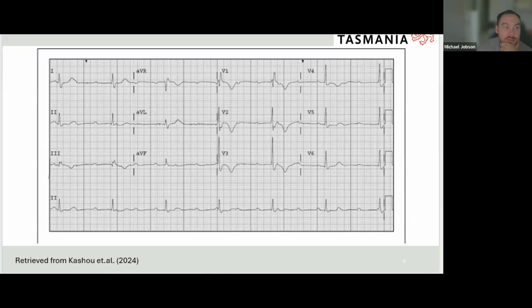If we look at 25 millimeters per second for this paper speed, that has to be right, otherwise our timing's going to be off. Each 1 millimeter horizontal box equals 0.04 of a second. So each large horizontal box, the width of 5 smaller boxes inside, should equal 0.2. Therefore, 5 large square boxes equals 1 second.